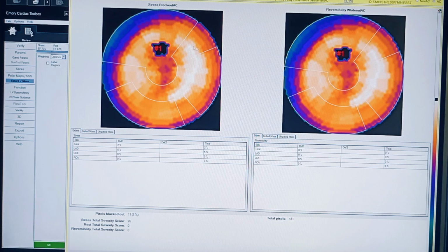जितना पार्ट रिवर्सिबल रहेगा, जैसे ये सपोज 5% है, समझो LAD का 5%, तो ये 5% अगर इसमें थोड़ा इम्प्रूव होता है रेस्ट में, सपोज इट शोज 2%, सो दैट मीन्स अगर ये 2% दिखा रहा है, मतलब 2% उसमें इम्प्रूव हो रहा है, 2% रिवर्सिबल है. ओके, देन यहाँ पे लेबल रीजन है, इफ़ यू वांट टू लेबल इट. ओके, देन फंक्शन.